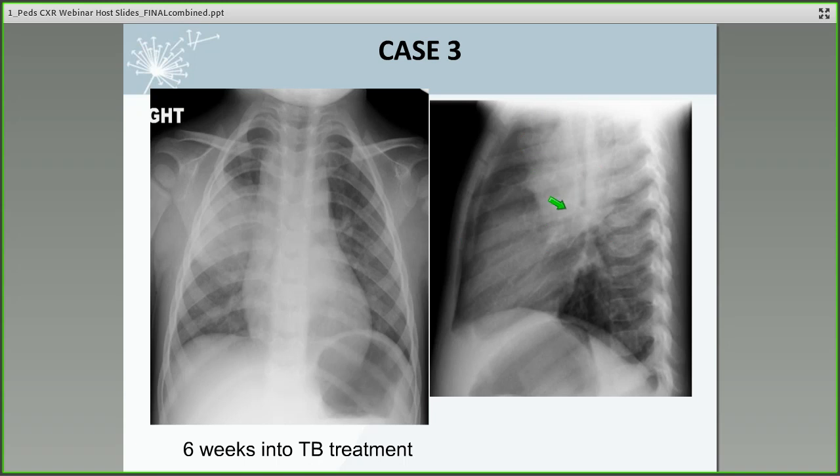Therefore, it makes evaluation of the adenopathy on the right side difficult because of this overlap density from the consolidation. Now, the consolidation, depending on the clinical symptom, should certainly be from a post-obstructive process, such as atelectasis or possibly post-obstructive pneumonia, where the trapped mucus gets infiltrated and gets superinfected.